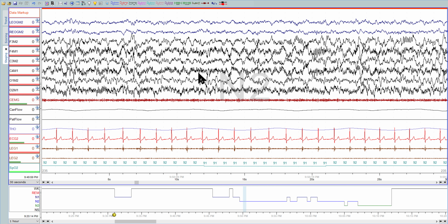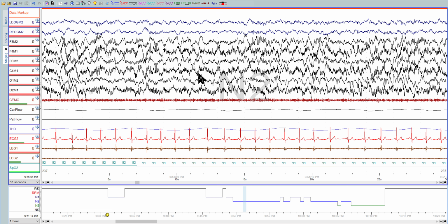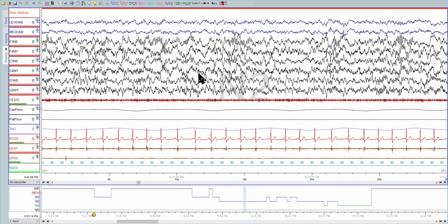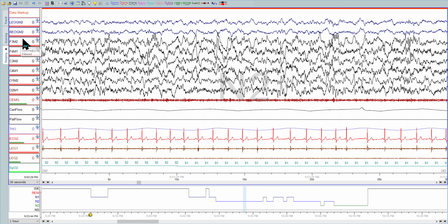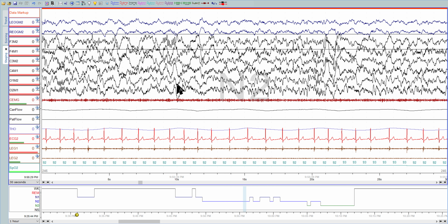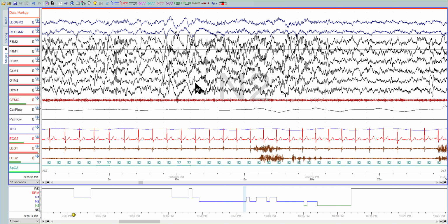And then 2, 2, 2, 2, 2, 2, 2. It's looking like 3 a little bit. Add my reference lines, not so much anymore. 2, 2, 2.